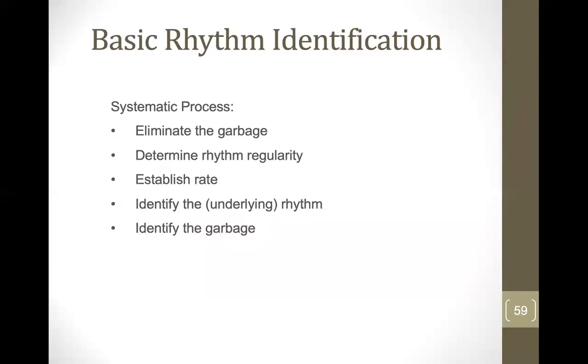When we're taking a look now at how we can tell what's going on with the EKG, and what the rhythms are that we can look at to find out if this person is healthy or not, we can go through a process in which we can analyze them. So we're looking at basic rhythm identification. How do we identify what the EKG rhythm is showing us and what it tells us about the heart? So it's a systematic process.